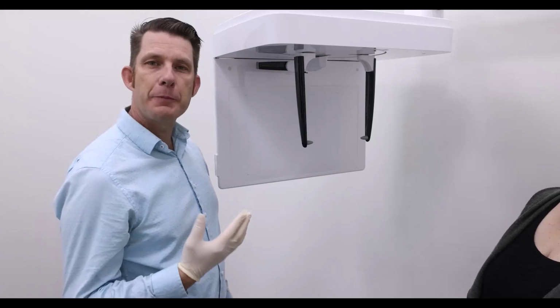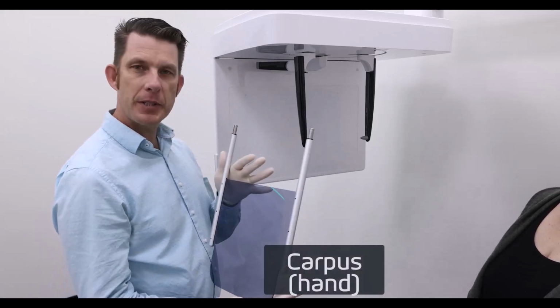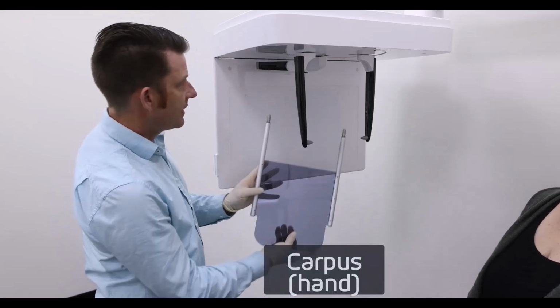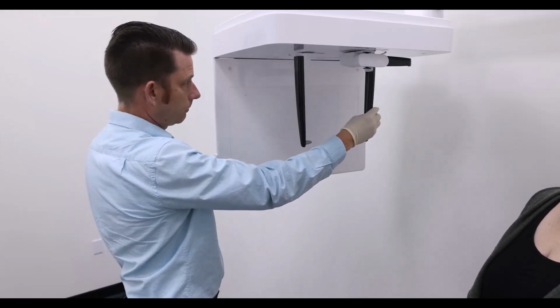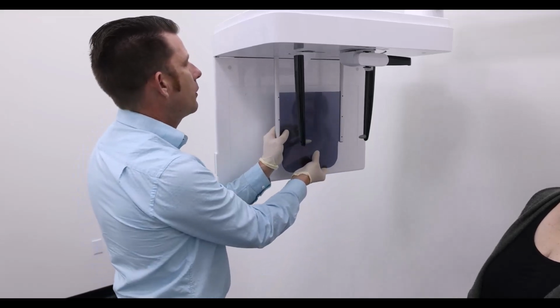Let's look at capturing our Carpus shot. I have my Carpus plate, which is one of the accessories. This is going to fit into the overhead, but first I want to rotate my overhead out of the way. I'm going to insert the Carpus plate.